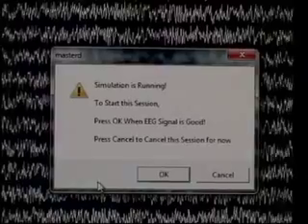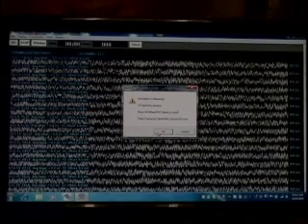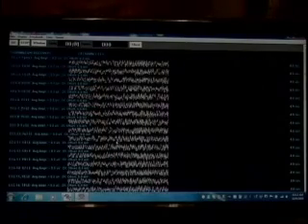It's then telling us a simulation is running. You're going to see that this is just a random noise signal. So this is going to give you good instruction on what those notch filters can do, even if you're training garbage for the most part. At this point, we hit OK. We see our signals running across the screen here. Very noisy, not something we'd want to do a brain map on by any stretch.